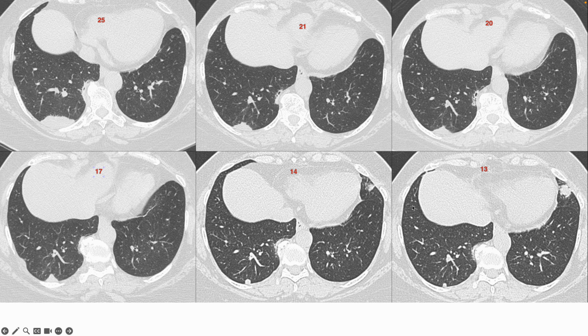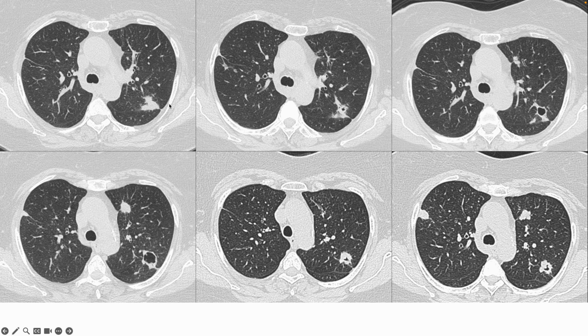If I just put all of them together, let's look at this lesion in the right lower lobe. It was a small nodule. 12 years later, it's increased in size. Whereas this nodule reduced in size and has almost completely disappeared. This lesion in the posterior segment of the left upper lobe increased in size up to 2014, then reduced and is now just an opacity. So there's a lot of waxing and waning, but the patient has become symptomatic again. There is a little more waxing than waning happening at this point in time. But this is over 12 years.